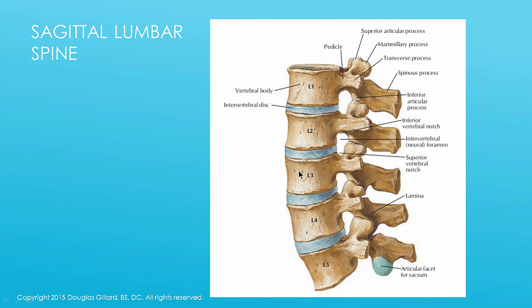Okay, this is called a sagittal view or a lateral view, but in the radiology world we call this sagittal. And this is a two-dimensional image. Now we don't have slices. With a CT and MRI, you get slices through this, so the computer can reconstruct a three-dimensional image, or you can look at each slice as you go through.